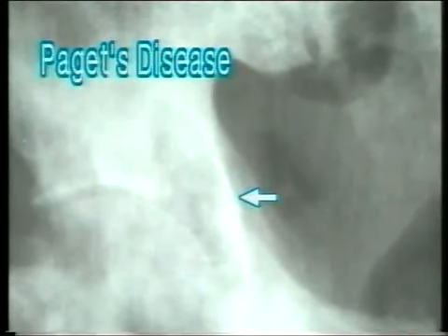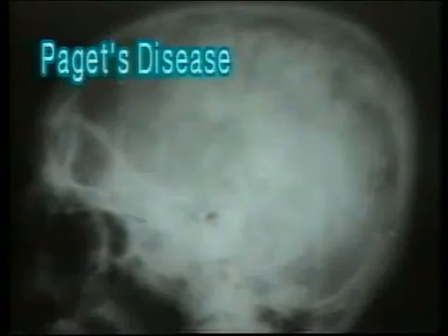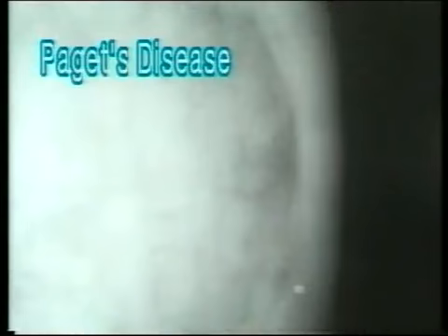So the features of Paget's disease are thickening of cortex and a mixture of sclerotic and osteolytic areas. The pelvis is the most common site of Paget's disease, the next being the skull. This X-ray of the skull shows a mixture of sclerotic and osteolytic areas. This is Paget's disease. In close-up view, note the thickened skull bone shown by the arrow and the mixture of sclerotic and a few osteolytic areas.